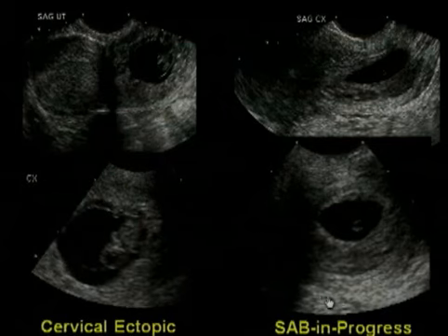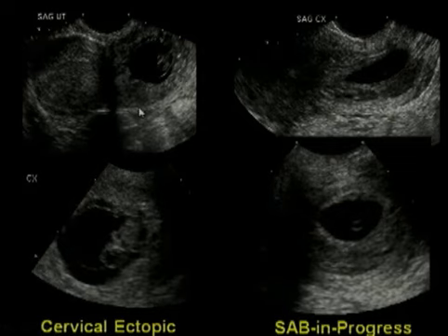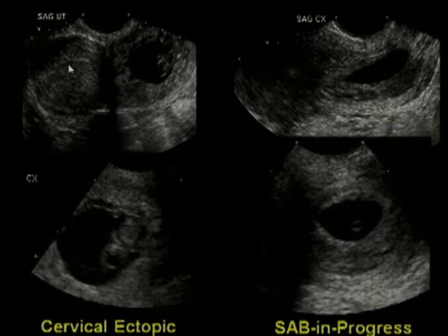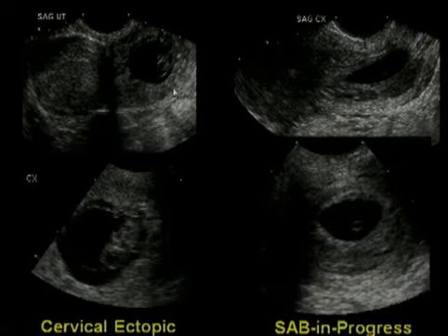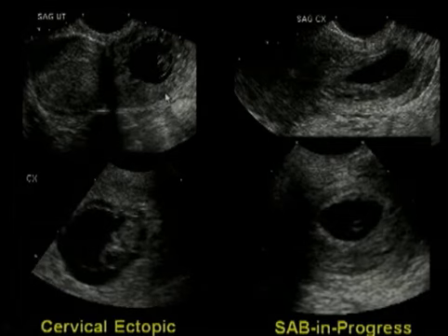And these are examples side by side. There is a transvaginal view of the uterus, and here's the cervix. Nothing in the body of the uterus. In the cervix, we see a gestational sac with an embryo and heartbeat. This is a very well-formed sac with an embryo and heartbeat. The only problem with it, and it's a big problem, is that it's in the cervix. This is a cervical ectopic pregnancy.